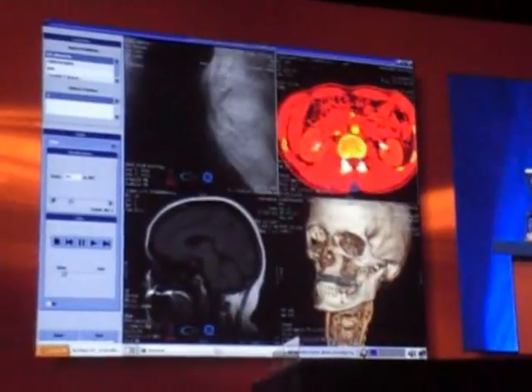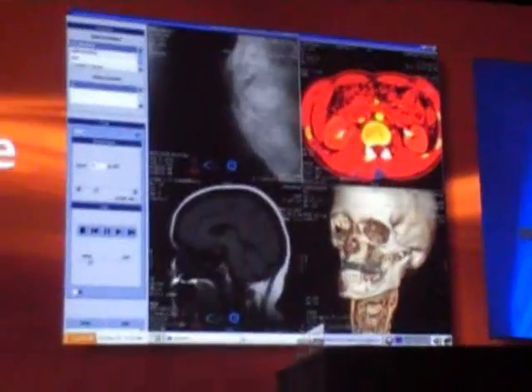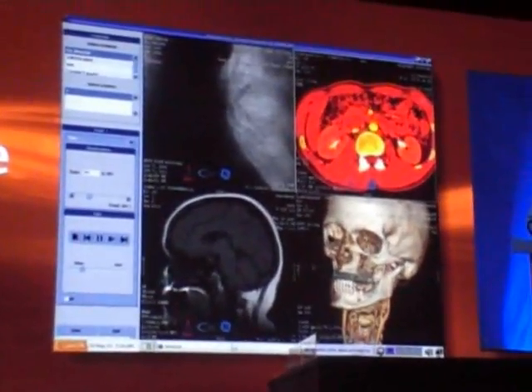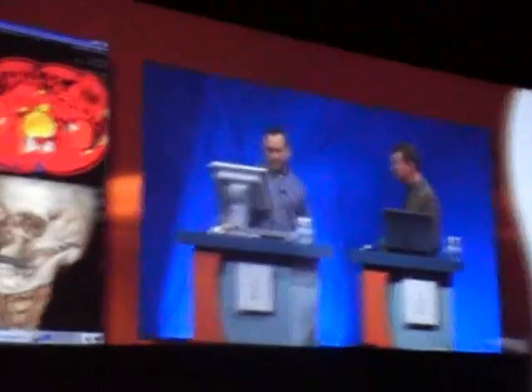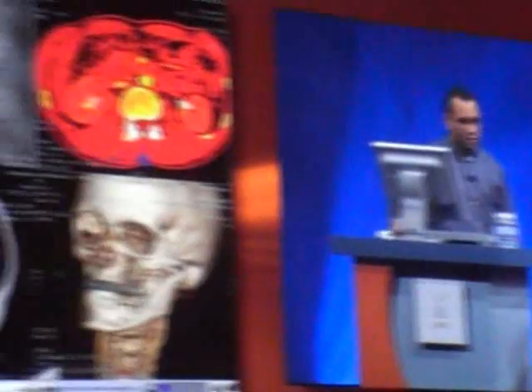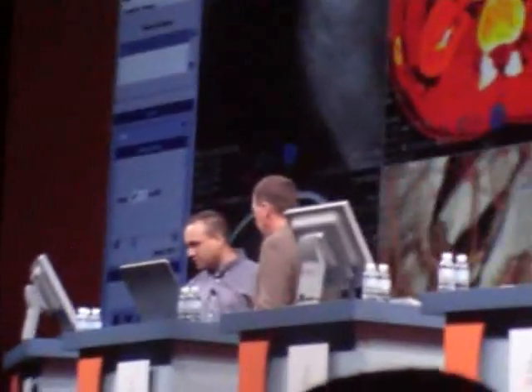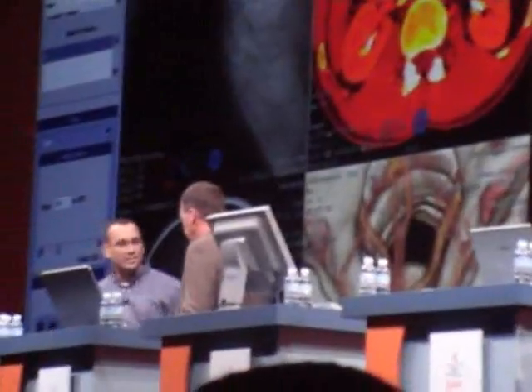Yeah, it has a red color map applied. And this other CT exam, which is the exam of a skull, is being displayed using a very computationally intensive technique known as volume rendering. And as you can see, Java is very much up to the task to visualize this data. You can zoom in and really get a feel for the detail that this technique provides. Very interactive and very visually engrossing, in my opinion.